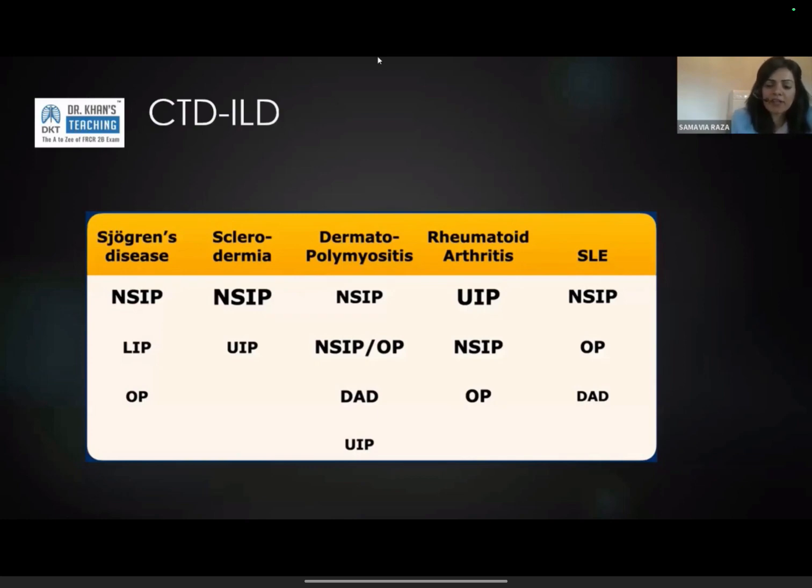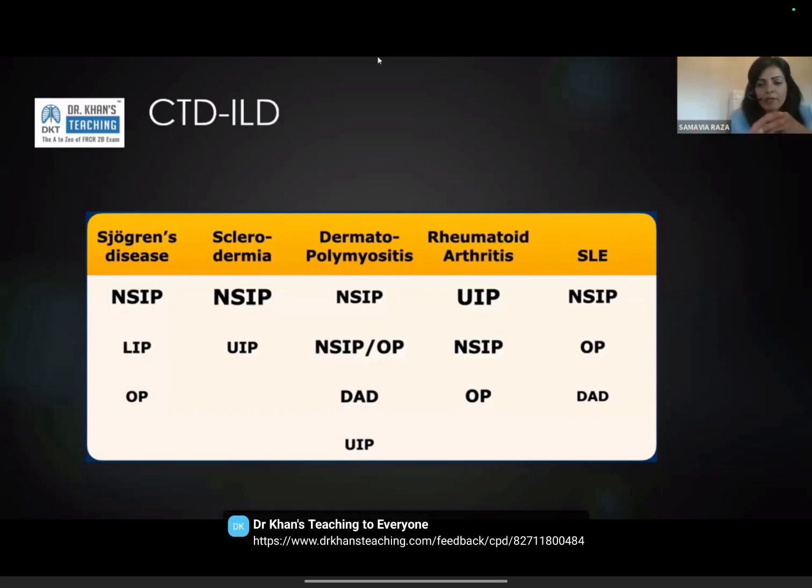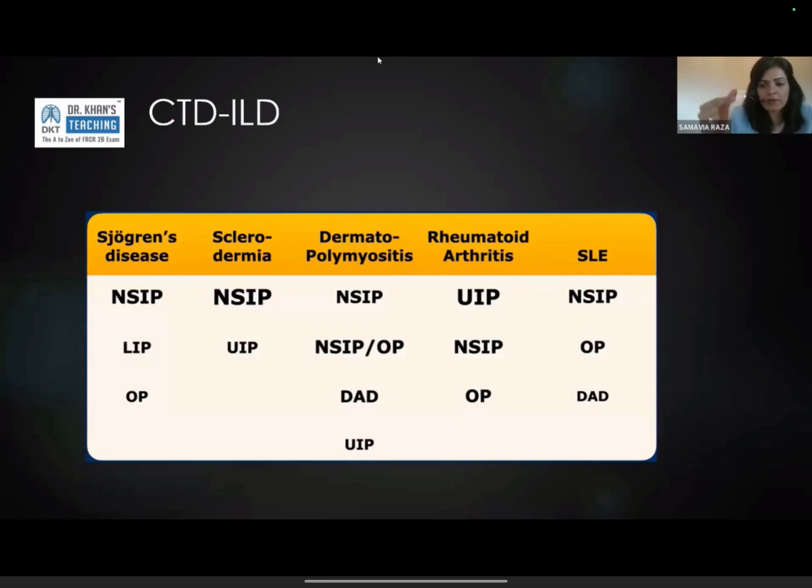So when I say bronchocentric, I mean it's tracking along the bronchus and then the end airspace, so the bunch of grapes around it. So when you see a nodular focus of consolidation, you can see an airway coming into it, and that's bronchocentric. Or you can say peribronchial when it's going along linear to the bronchus, so interchangeable. Peribronchial when you want to say linear, when you say blobs of nodular consolidation, when you can see a bronchus going into it is bronchocentric.